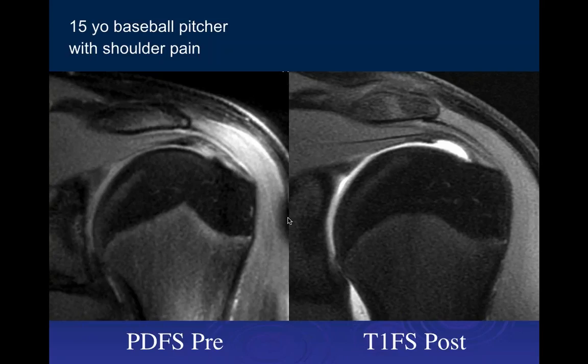So I'm just pointing that out as differences between a non-arthrogram and an arthrogram examination, because we don't often see the non-arthrogram and arthrogram in the same patient. So this just lets you see the difference of the way a lesion looks with and without arthrography.